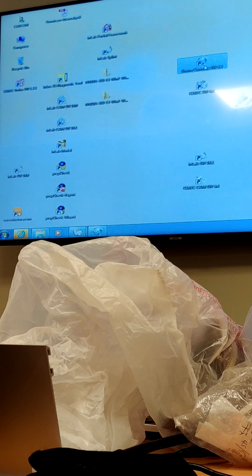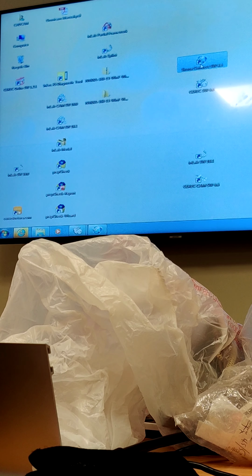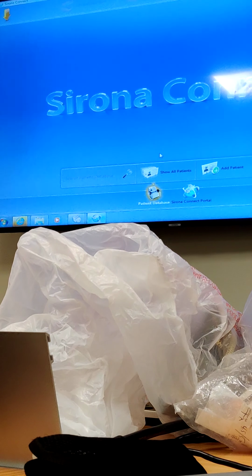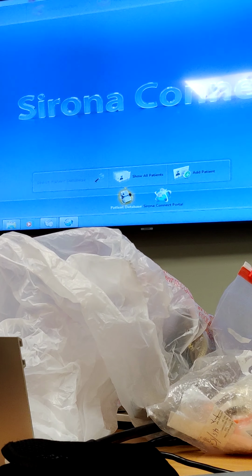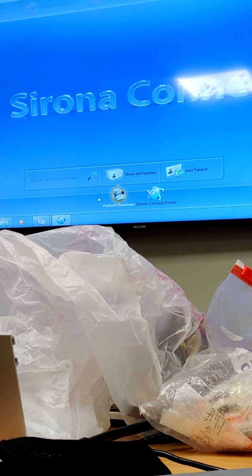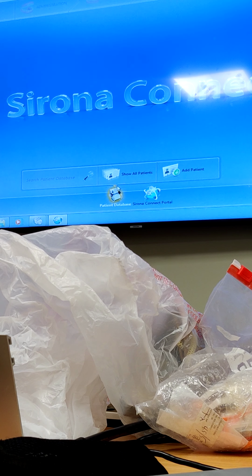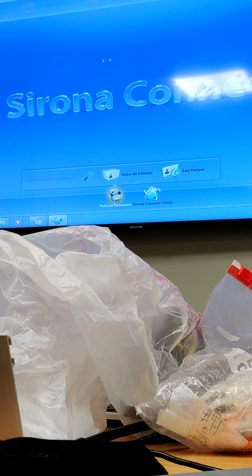how to transmit to Atlantis. Okay, now I'm taking a chance here because I don't know for sure if they, I asked them to set up Atlantis as a lab, but I don't know if they did. Okay, so I'm on Cerec Connect.